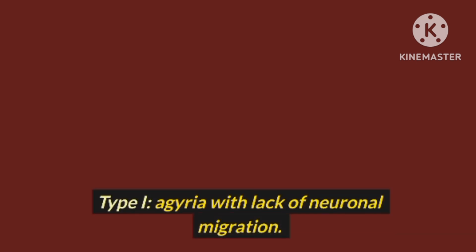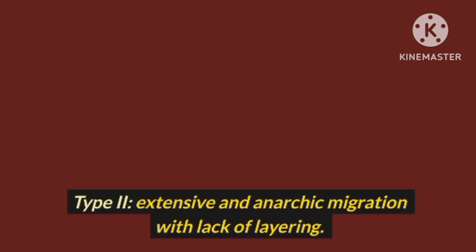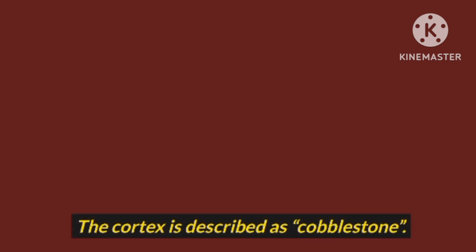There are two types of lissencephaly. Type 1, agyria, with lack of neuronal migration. The cortex is smooth and thick. Type 2, extensive and anarchic migration, with lack of layering. The cortex is described as cobblestone.